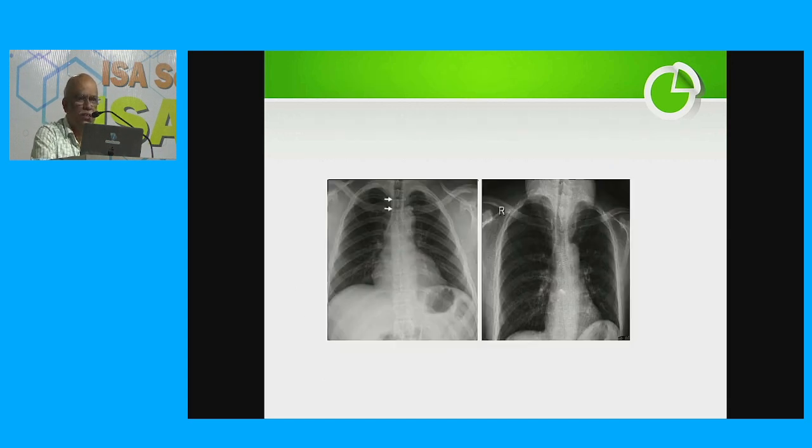Can you compare these two X-rays and tell me the diagnosis, focusing on the trachea? In the first X-ray, it looks normal. The second X-ray shows the tracheal region. There is a narrowing of the trachea. Yeah, you can see the trachea, the airway shadow is darker. So what are the different diagnoses? What is the commonest diagnosis? Tracheal stenosis. Tracheal stenosis is the commonest thing with the trachea.